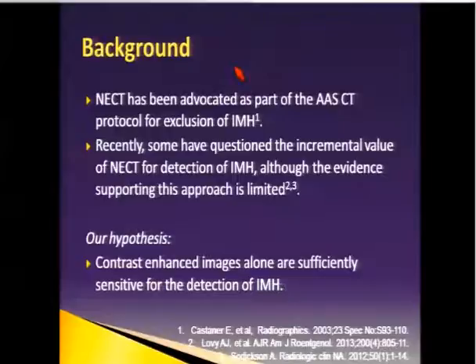And although this has been advocated as part of the protocol, recently some people have questioned the incremental value of the non-contrast phase, although the evidence in the literature so far has been limited. So we hypothesized that we could detect intramural hematomas alone with contrast-enhanced images only.